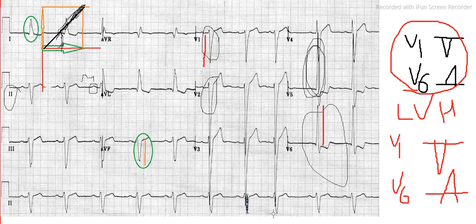So it is around 75, but you see that it is not regular. You see here 1 2 3 4, but here 1 2 3 4 5 6, again 1 2 3 4 5. So the rhythm is not regular in this case.